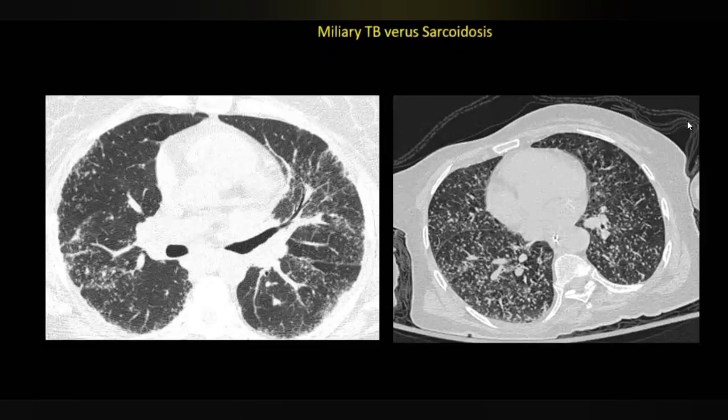nodular spread, but that is more so in the basal or dependent area. In sarcoidosis, upper and middle lung zones are more involved. But any other differential diagnosis? Pneumoconiosis, okay? Like silicosis, bagassosis, berylliosis, etc. Except for asbestosis, because asbestosis affects the lower lung zones. Okay?